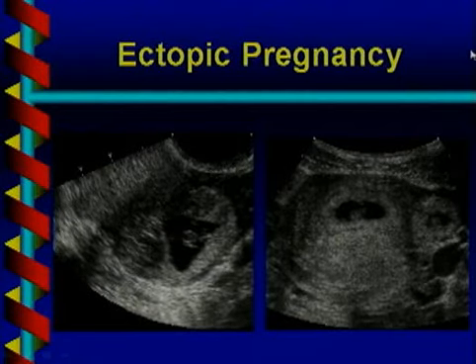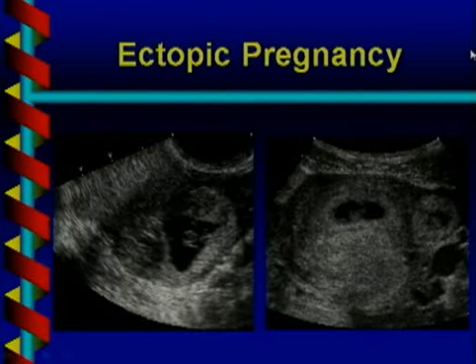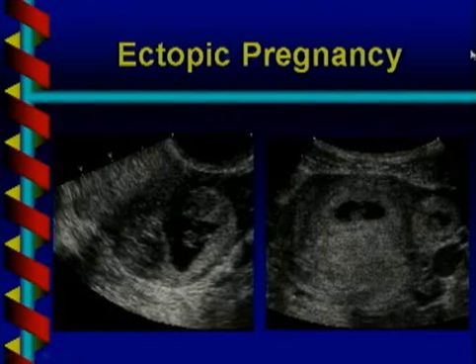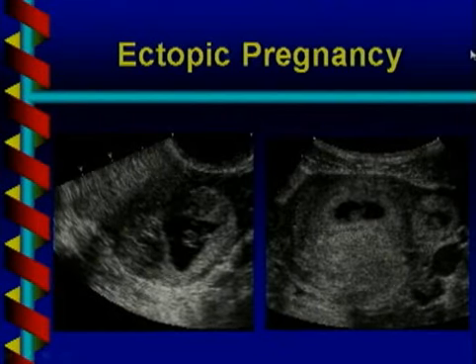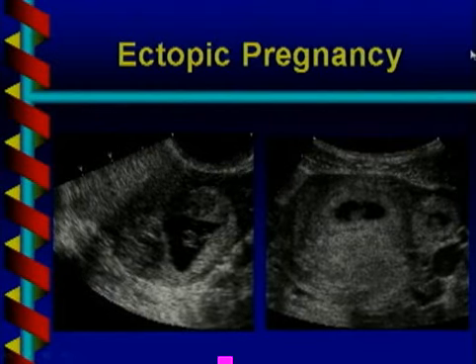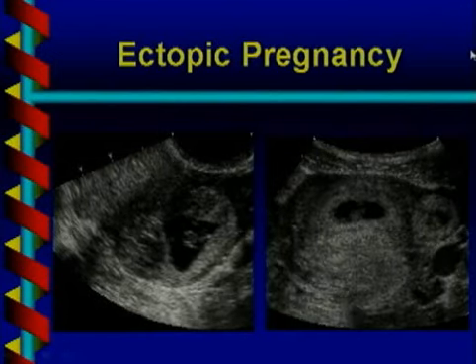I'll be spending the next half hour on an important topic, the topic of ectopic pregnancy. As you can see here on my title slide, I'll be talking about a variety of different kinds of ectopic pregnancies. The slide on the left shows a live ectopic in the left fallopian tube.